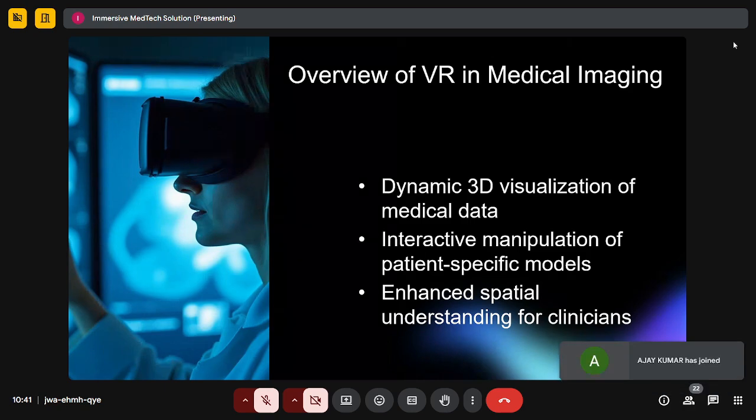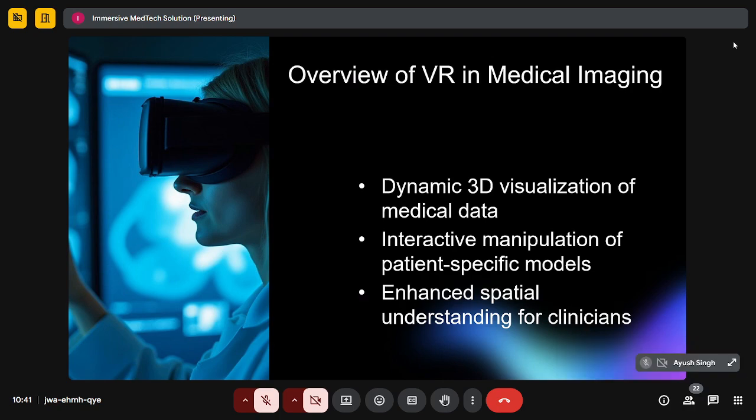Now, if we have created an implant and we need to see how the positioning is and how it's performing, we can directly take the particular implant in our hand. Through our hand means we use the software using a controller. We can also use it directly with our hands and finger control, but it's slightly tough to adjust with fingers in the virtual environment. So we have the option of controllers, which I'll show further.